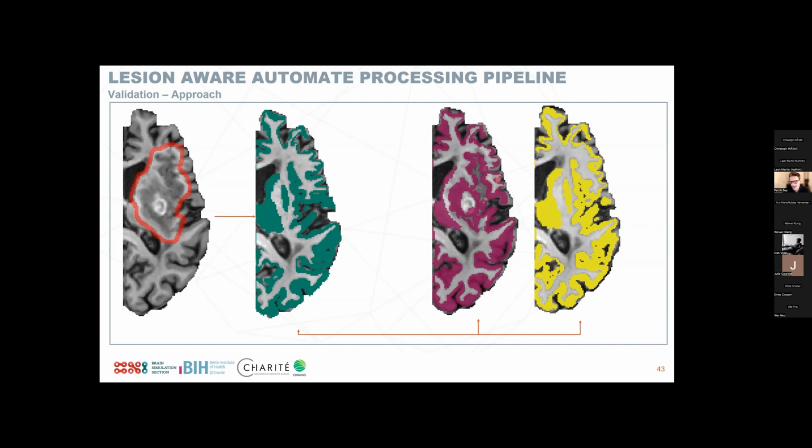And we can directly see in the HCP, where we do not have these lesion mitigation measures, we exactly get into this issue that I mentioned before, where now these subcortical lesions are actually treated as cortical regions. Because of these abnormal intensity values, it's misclassifying voxels here as being part of those cortical foldings that we see in the actual ground truth here, but that is distorted here in the artificial lesion brain.